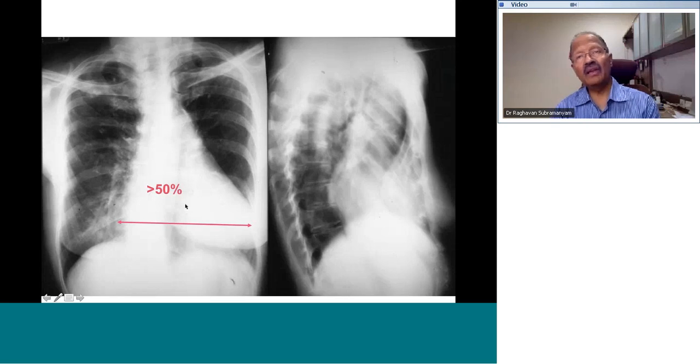Now, occasionally you do find cardiomegaly that cannot be explained by the physical findings. Be careful that there are no other contributory factors. If you look at this X-ray very carefully, there is a slight scoliosis of the spine. Chest deformities are one of the most important causes of altered CTR, and if you are not careful, you may mistakenly diagnose cardiomegaly.